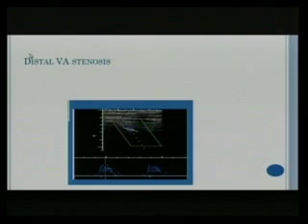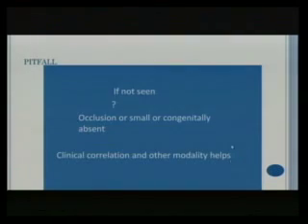So just one example, this is a distal vertebral artery stenosis, because this vertebral artery, number one, has become like a tabletop. It's very, very spectral broadened, and there is no antegrade flow in diastole. So you know this is becoming a high resistance waveform. Now, the tardus parvus waveform, as we know, can occur in a post-stenotic segment, which is late and slow, and we have all seen that, late and low. And stenosis at the vertebral artery origin, we've all seen that before too.